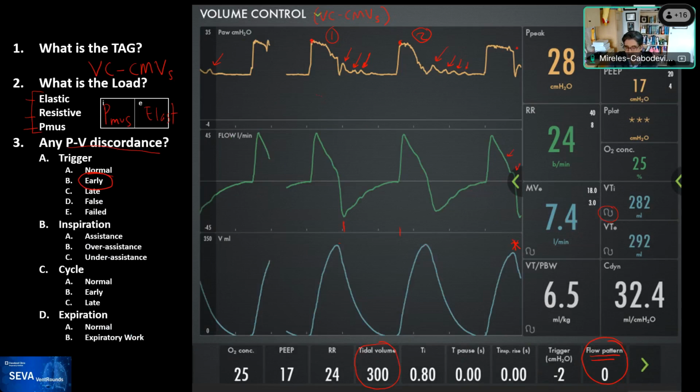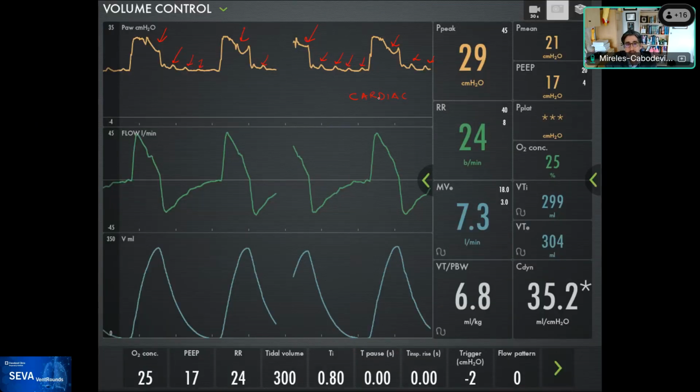So do think the following. Whenever we have oscillations on the airway, like these ones, it can be cardiac or it can be fluid in the circuit. Yeah, Karsten puts fluid in the circuit. Or it can be secretions, sometimes in the ET tube or in the airway. It can also be excessive dynamic collapse of the airway, and we see that in tracheomalacia and whatnot. And each one of them has different behaviors. So let's try to dissect which one of these it is.